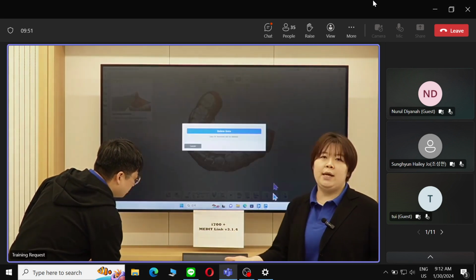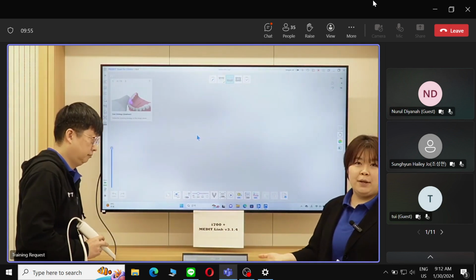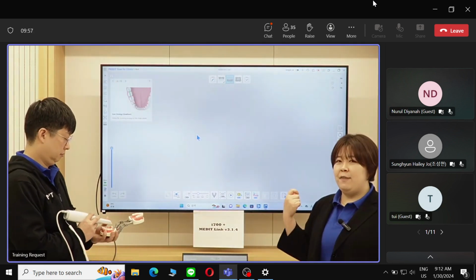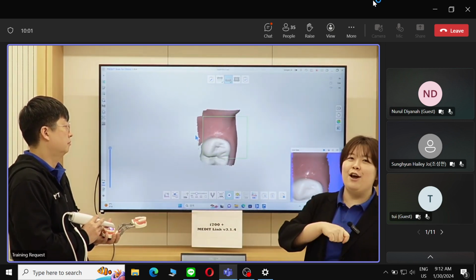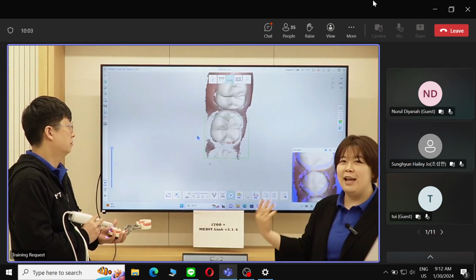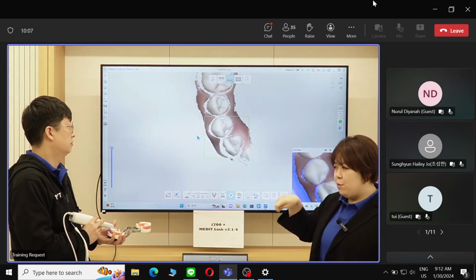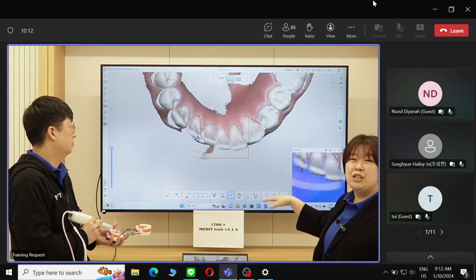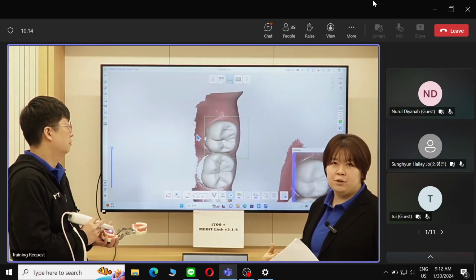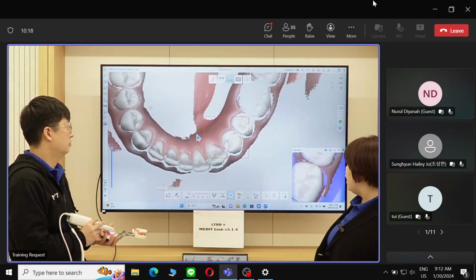But what we want to say is, if you're a less experienced user, at a beginner entry level, you might be thinking, oh, they said scanning is fast, so that means I could just scan along the arch and move my hand quickly and I will be getting data. But in that case, if you weren't following the right scan protocol, you would experience interruptions in data acquisition. But of course, we want to be getting the right data for prosthesis in the future.